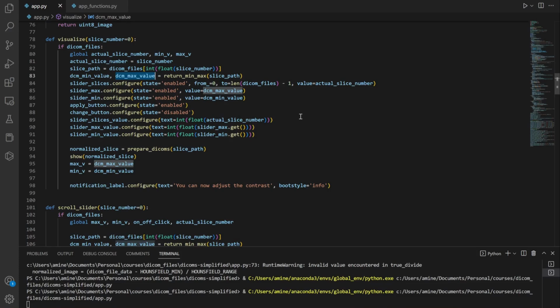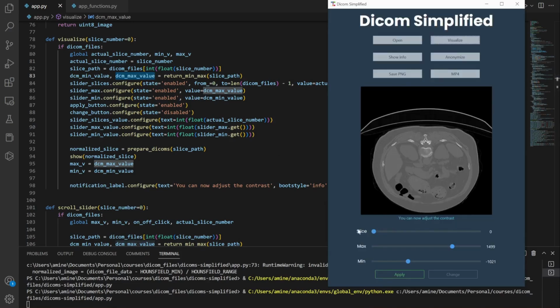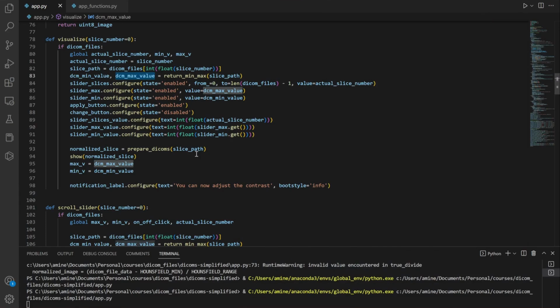how do we call it? The labels. So you see whenever we have the slider, we have this label, which is the title, we have the value, and we have this label that prints the value. So we need to update this as well. Okay. So after doing that, we are just okay.